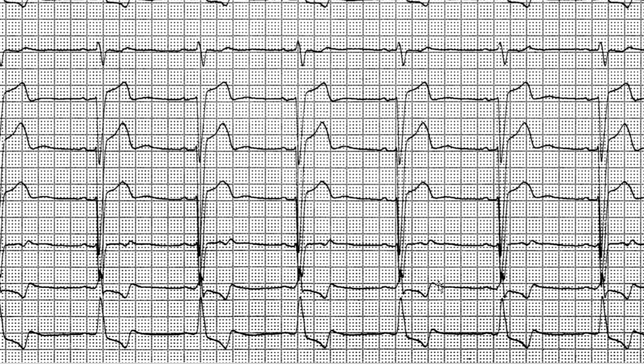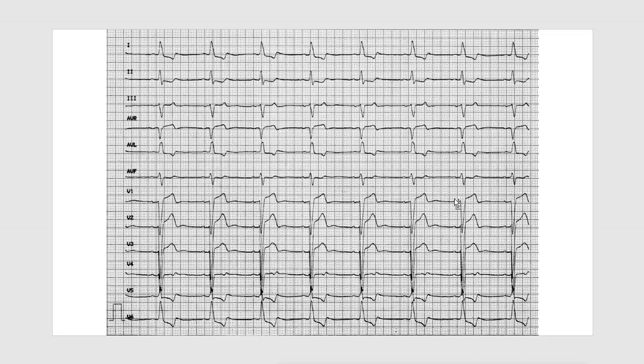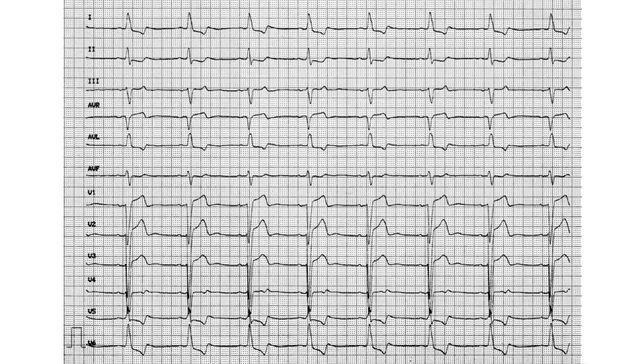Yeah, biphasic pre-terminal negative, i.e. pre-terminal means the first part, okay? This is the terminal part, this is the first part. So the terminal part is positive, but the pre-terminal part, i.e. the beginning part, is negative. So we call it biphasic pre-terminal negative, okay? That is that part, and QT, I just measure the QT.